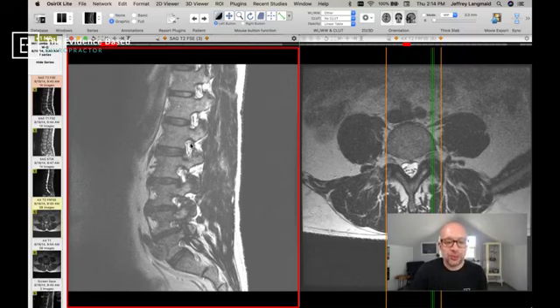When we go down here, we see again, look how tall that space is and look how wide it is. And the next one, all right, that starts to look a little bit hourglassed or a little bit like a keyhole. And why is that? Well, we see a little bit of that dark disc poking out into the bottom. It's not really compromised, but it is less than perfect, right? And if we go down one more level, ooh, gosh, that white space is starting to look a lot thinner, or there is not nearly as much white space here as we had way up at the top here.